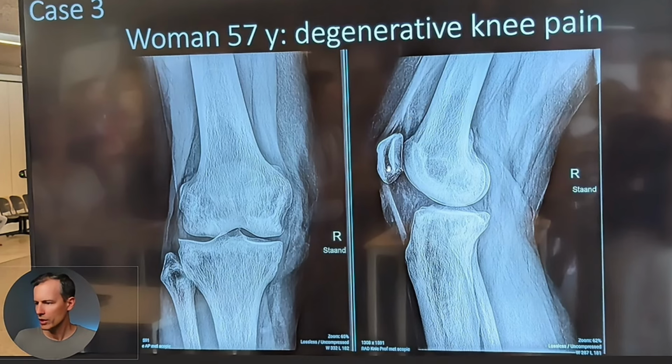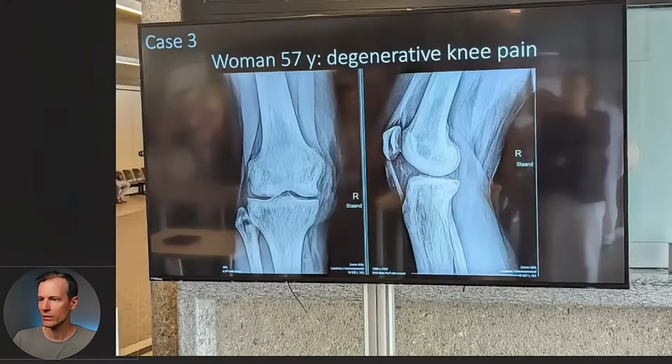So no effusion, we see the patellar tendon and quadriceps tendon perfectly fine, Hoffa's fat pad is normal. We don't see much here, no chondrocalcinosis. So there's no explanation why there should be knee pain, at least not from the bone perspective. I think the bone is kind of an incidental thing, a generalized systemic thing. So let's go to the next image, not this one.